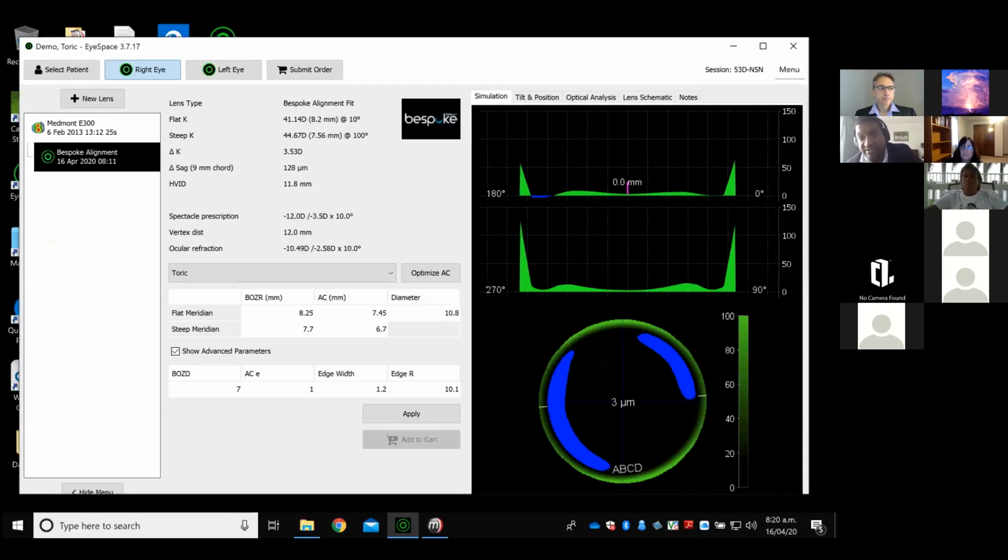And as you'll see from what Darren's saying, many of our doctors use the software to help their new associate docs who have limited GP fitting knowledge, and they also use that product, the Zeiss Profiler, as well. Yeah. Jagger, this might be a good time maybe just to run through a demo of doing a reference map and just showing how easy it is.